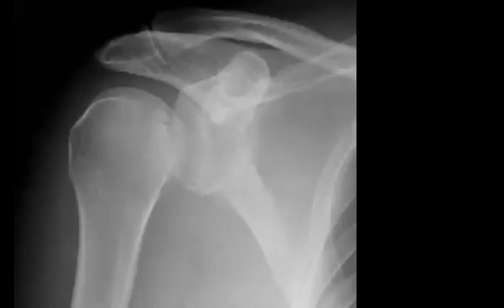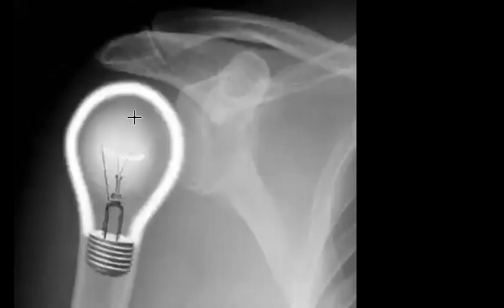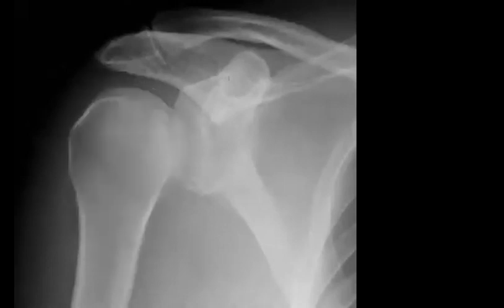But when we give you the history, it will be a history of epileptic fits or epilepsy. Nice. So you can imagine that this patient sometimes has bilateral posterior shoulder dislocation. And this is what is called the light bulb sign. So let's try to describe what happened here.